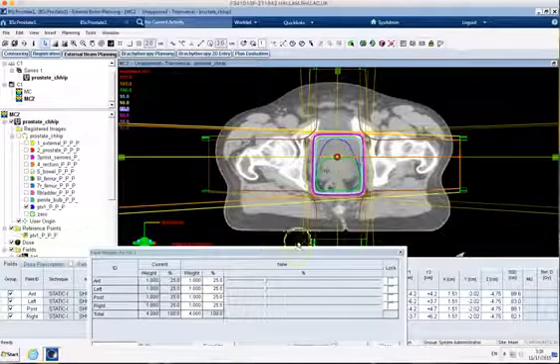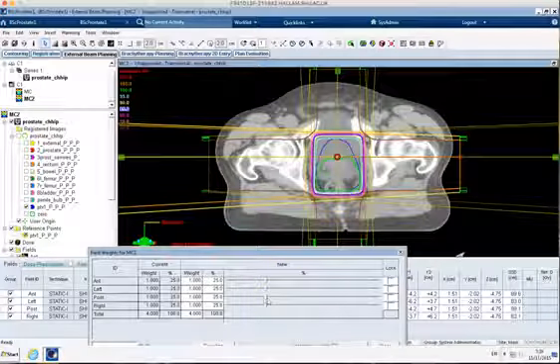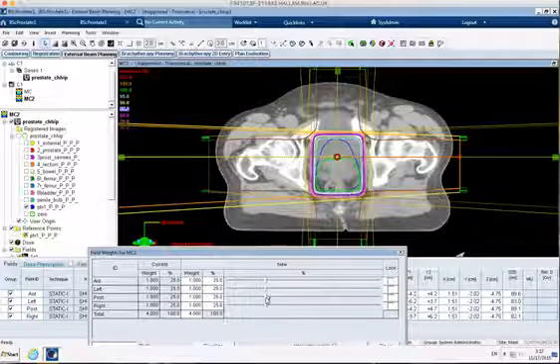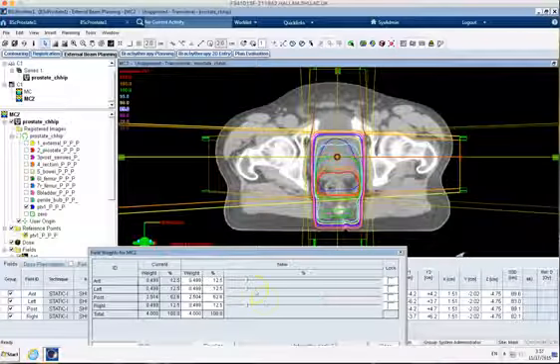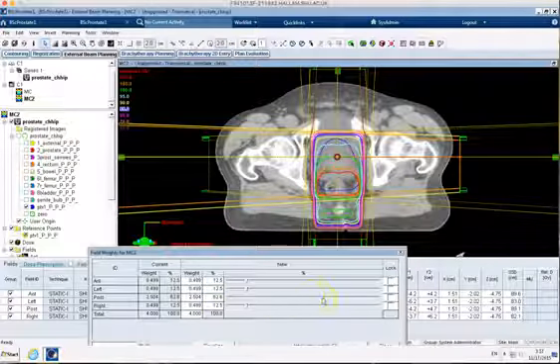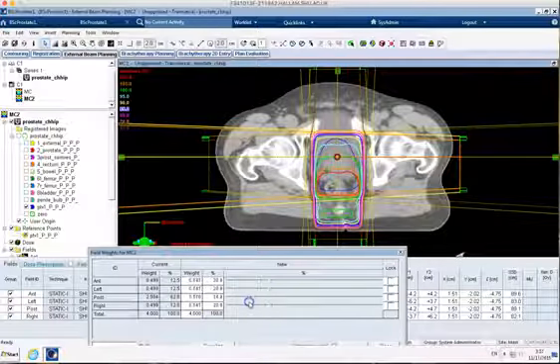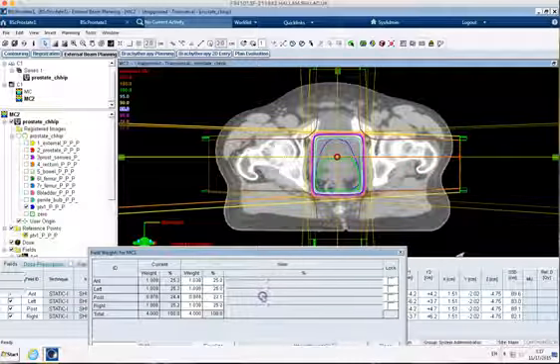And so there's a number of ways I can do that in Eclipse. The easiest way is to use these slider bars. And so what I'm going to do, there's my post field, this one here, and you'll see if I wanted to increase it, it increases it and it reduces the others, so we always want it to add up to 100. And this is a really nice tool on this bit of software that actually does the maths for you. On some other bits of software you have to work it out yourself.